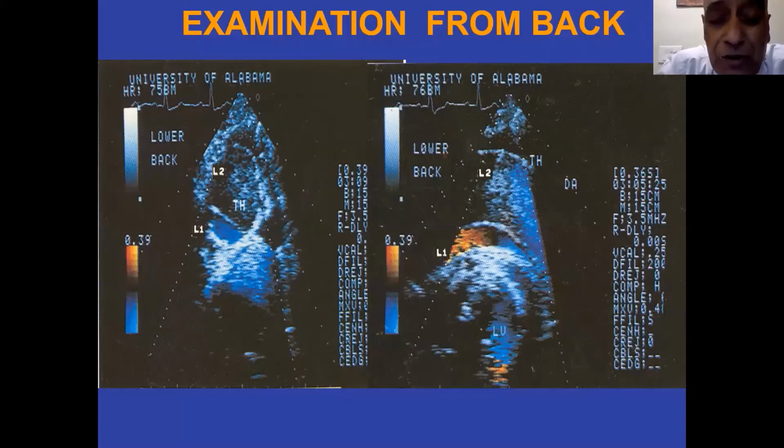Now, if you take the apical four-chamber view, the right superior pulmonary vein comes very close to the atrial septum, and it comes a little horizontally. What you get as a vertical vein is actually a right inferior pulmonary vein. There's a lot of confusion in the literature whether that should be the inferior pulmonary vein or the superior. I prefer to call it the inferior pulmonary vein, which you get vertically connected just next to the atrial septum in the atrium.